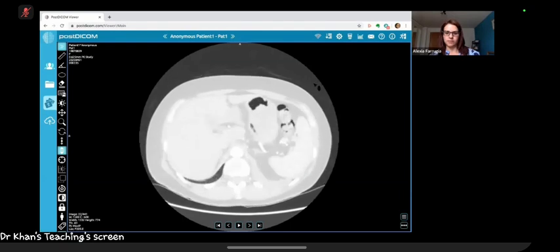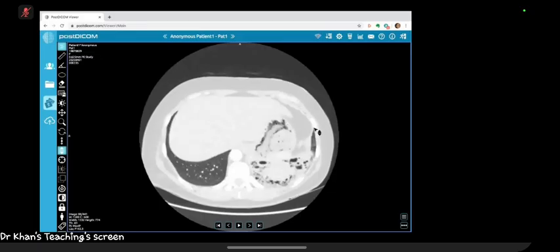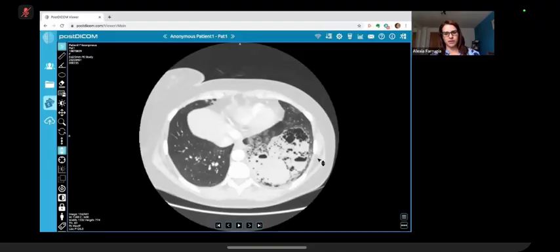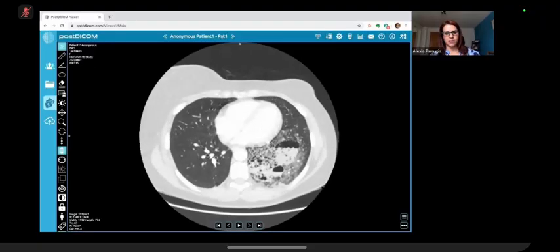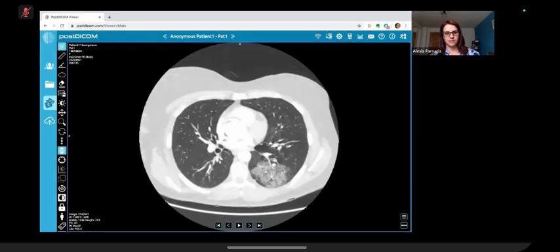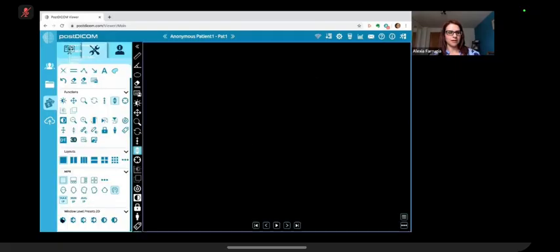The upper lobes are normal. Okay. So I'll go back to the soft tissue window. Okay. Let's go back.